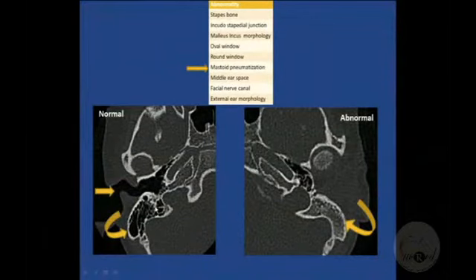That's a mastoid process which is normally pneumatized. On the left side, the mastoid is small, hypoplastic. That also makes the temporomandibular joint lift up a little bit, and you will see the head of the condyle of the mandible at a higher level than the right side.